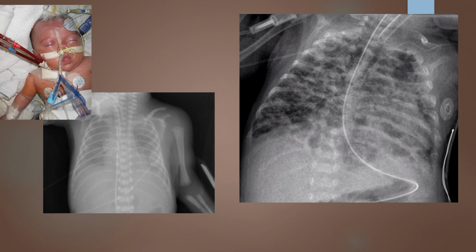If we look at this particular x-ray, we're going to go through all the requirements here really quickly. So here we see apex to costophrenic angle to apex. We have all the anatomy. We have soft tissue detail, bony trabecular pattern, and contrast. Our contrast is very, very low in this patient, so we might have to reduce the kVp or see if they could window and level it out to a more appropriate level if our exposure index is adequate.